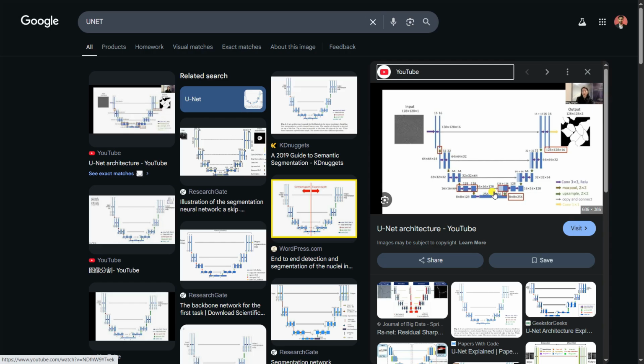If you need a clearer explanation, you can go to my YouTube channel and follow how I code a UNET architecture from scratch. It has convolutions of 3 by 3 with ReLU, max pool of 2 by 2, up sample of 2 by 2, and copy and concat.